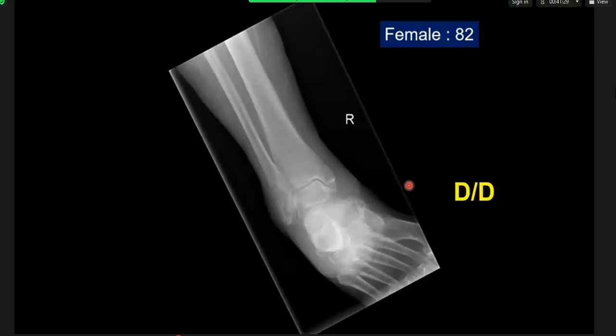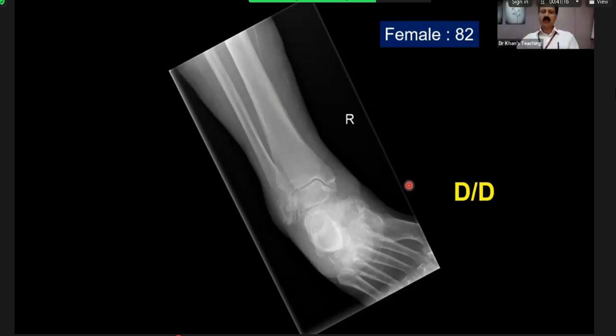So it can be HOA as well, but then it can be vascular insufficiency related to deep venous thrombosis disease or varicose veins. Do you see any stigmata on this case? There are vascular calcifications that I can see.